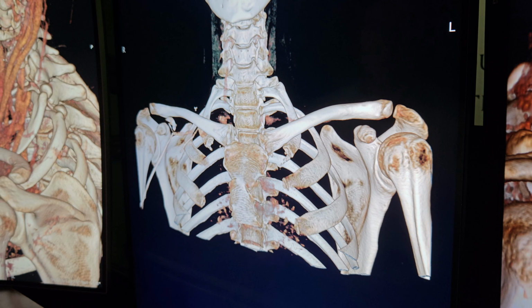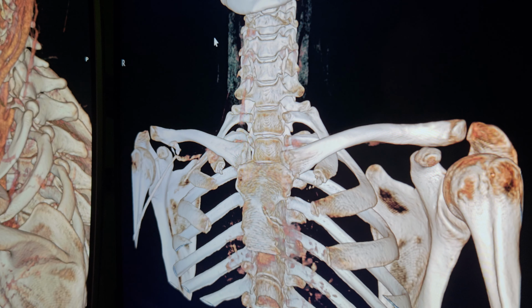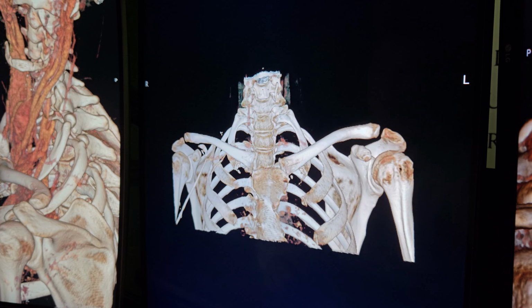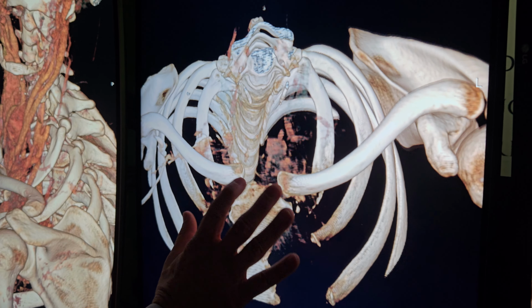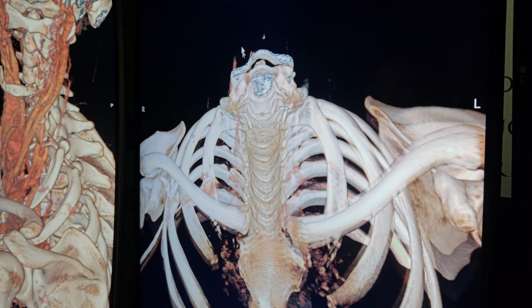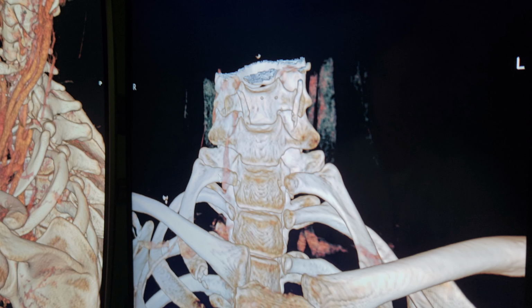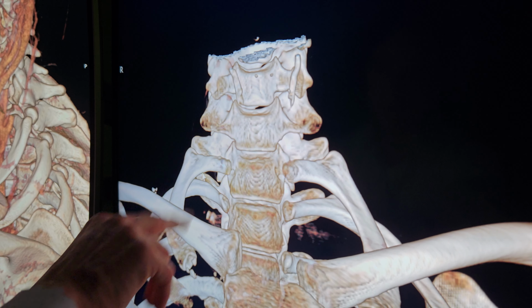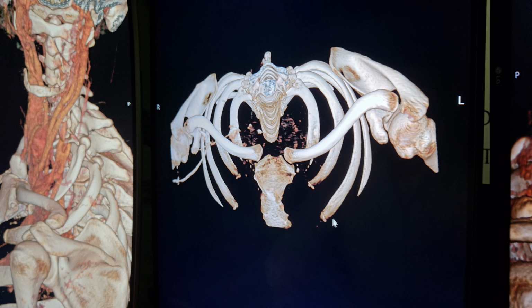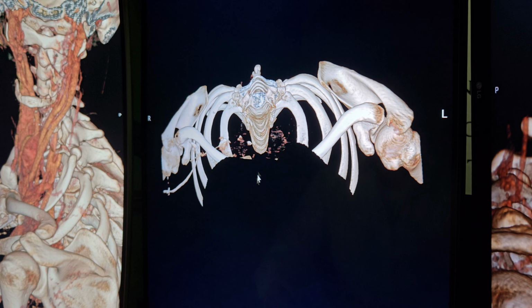So here we're seeing the first rib on both sides being pulled down. My current working diagnosis is that when you had that compression injury, the rib cage was pushed down, compressed, first ribs popped out of their normal location, and they're below where they should be. Let's get that a little bit better. So this first rib, I'm going to dissect that better. Let's remove the clavicle, manubrium, all these structures that are messing with us.